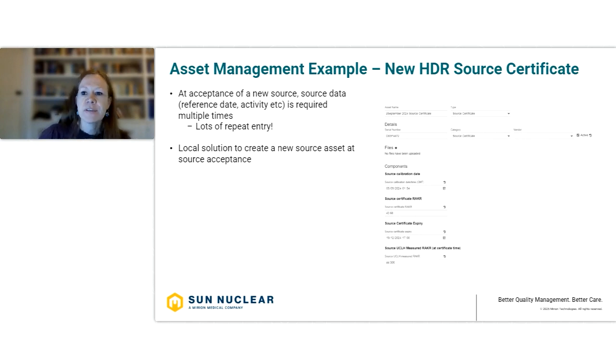So we've mainly used asset management as a chamber library, but it also has really useful functionality if you've got lots of repeated data entry, because we know that one frustration with SunCHECK is that one template can't talk to another. So you sometimes have to transcribe data between one and another. A prime example of that for us is when we get a new HDR source. We have two teams come in and measure the reference air kerma rate, and they're both comparing it back to the source certificate. Then an average of that is calculated and put into our planning system. And that average value is compared against when we do our monthly reference air kerma rate measurement.